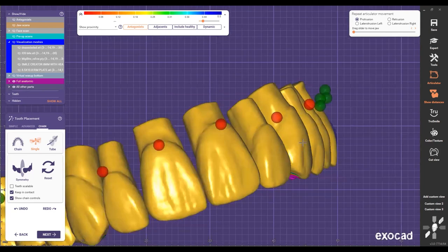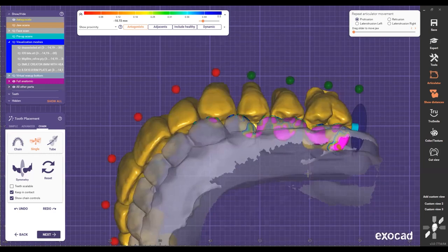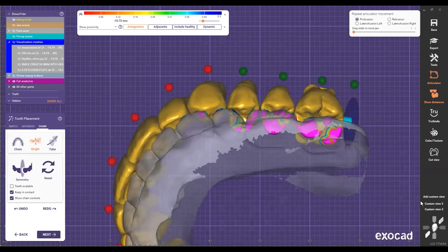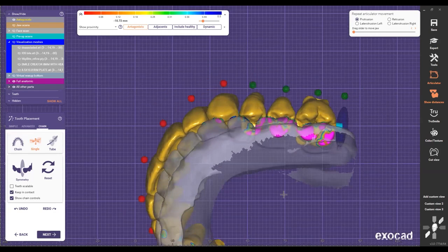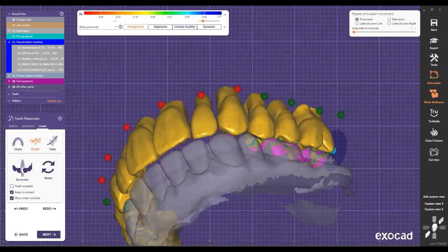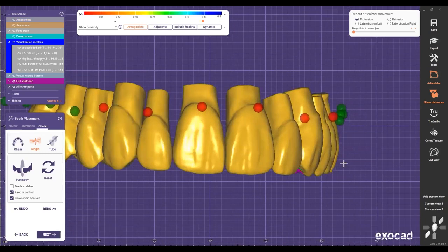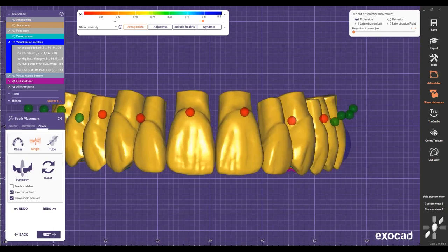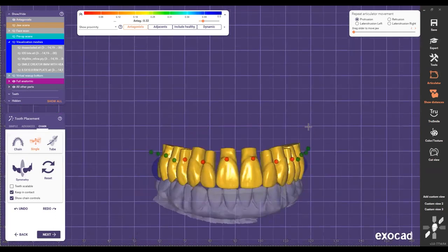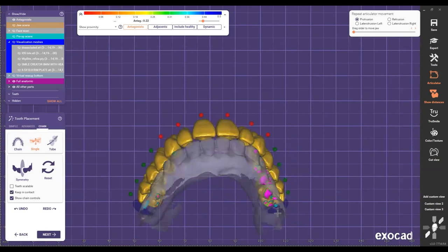And then turn on the articulator. It looks good. So now what I'm gonna do is compare if my curve is moved a little bit higher. Now I can just bring this out a tiny bit, check back. Beautiful. So now I have everything there, right? Everything is ideal. I have my ideal setup. I didn't have to stretch, scale, or anything like that.